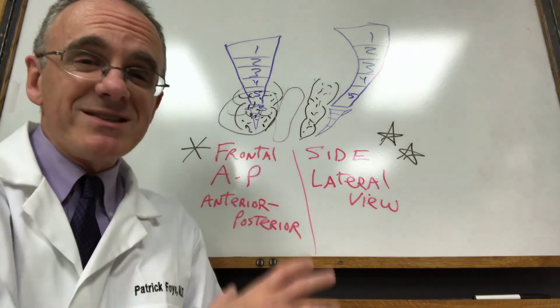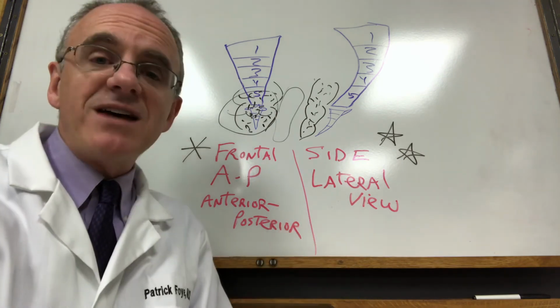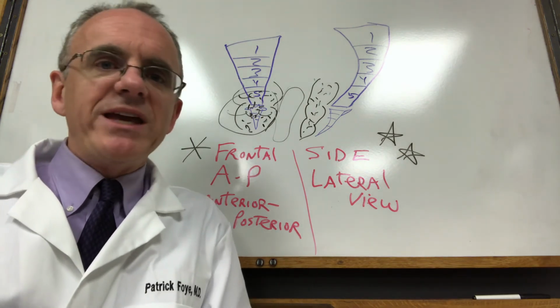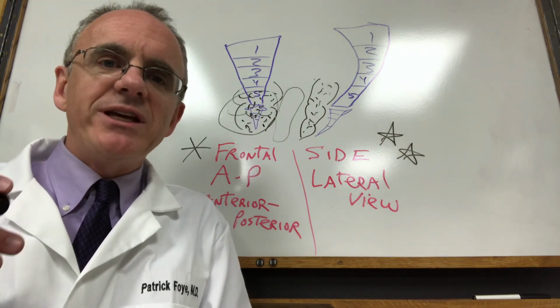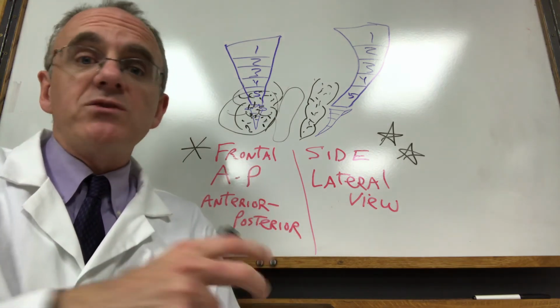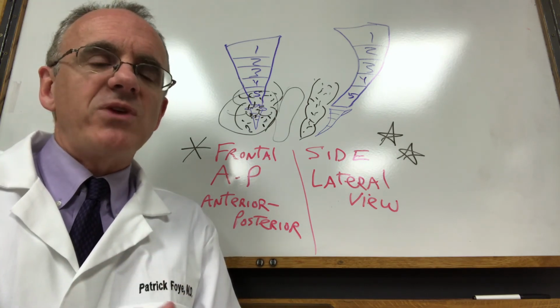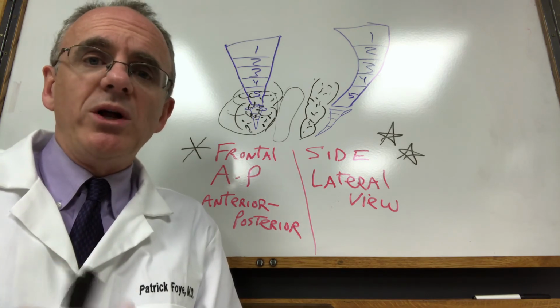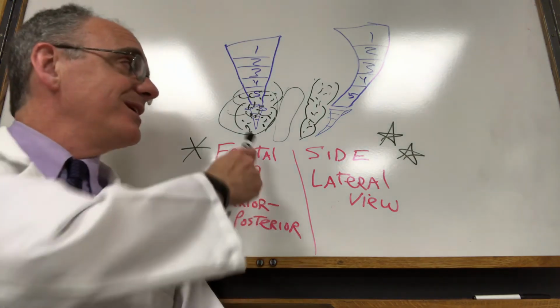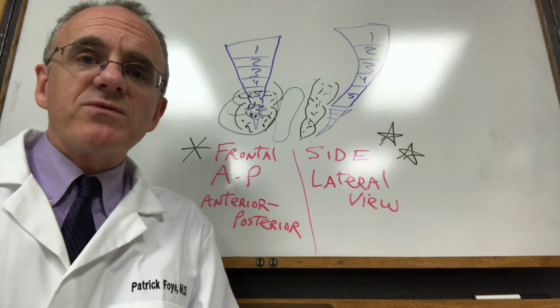Frontal view can help with some things, but really what's most important for people with tailbone pain usually is that side view or lateral view. And I see this very, very commonly. Patients fly in to see me from around the country and sometimes internationally. And there's unfortunately lots and lots of times where people bring with them their CDs, which I appreciate, and we look at the imaging on the CDs of their x-rays that they were told were normal years ago when they first started having tailbone pain, and we realize there's not a decent view of the tailbone to begin with. And that can be very frustrating, of course, for patients.